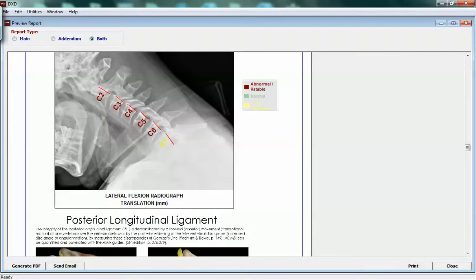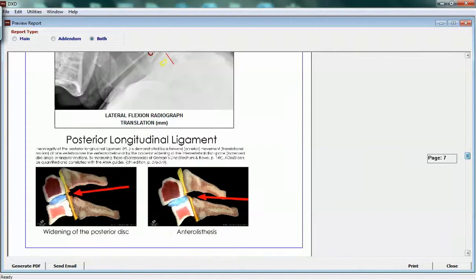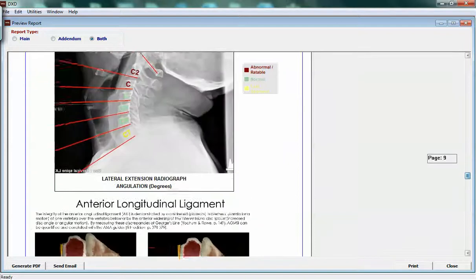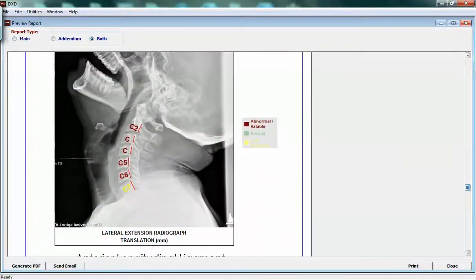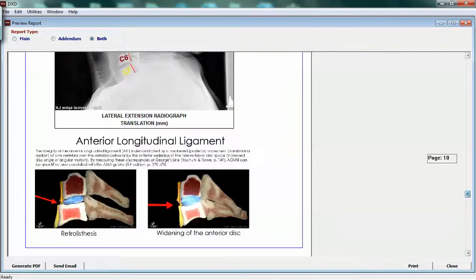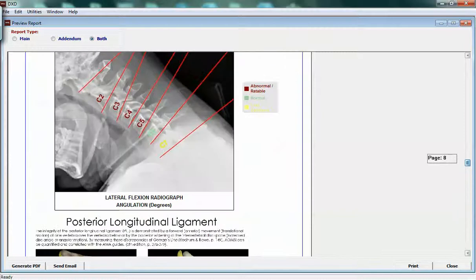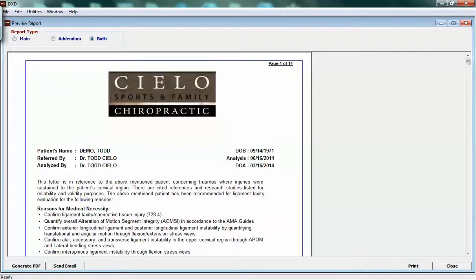It's always in the same direction. You're looking to make sure that you hit the bottom of these end plates. Again, you're looking for the smoothness of George's line all the way down. So please consult this when you're having questions about plotting of the points.